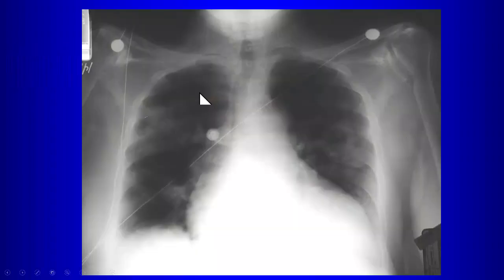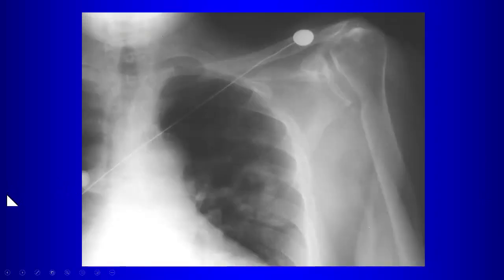Okay. All right. The findings on this chest radiograph. Do the lungs look normal? First of all, there's a big heart, but I'll give you that. Do the lungs look normal? Yeah, there are peripheral consolidations. It looks like we have some patchy opacities within the lungs. Let me give you a close-up there. Do you notice anything about the opacity here? It's cavitary. So what could this be?